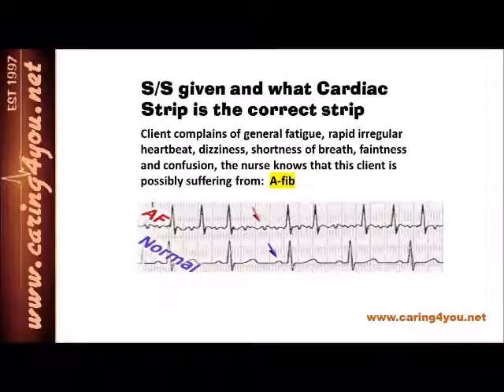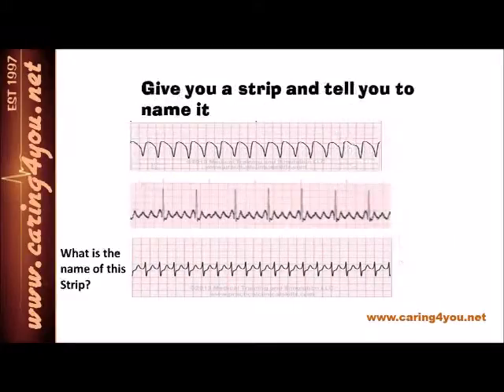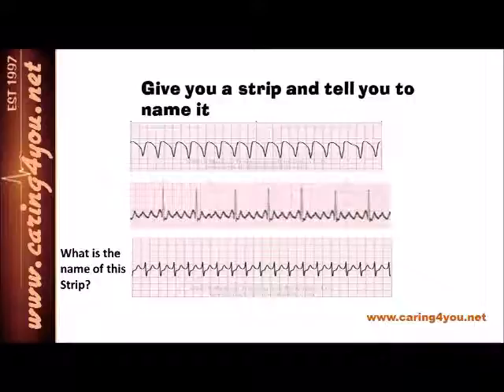And then the last kind of question the NCLEX will give you is it'll give you 3 or 4 strips, right? And it'll ask you to name it. So what is the name of this strip?